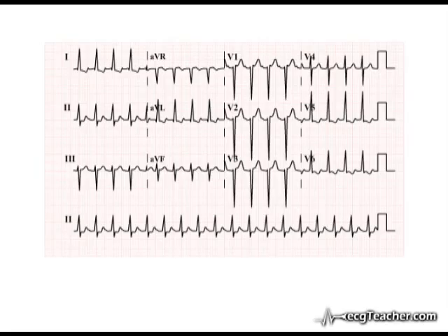We note that his heart is structurally abnormal, with clear evidence of left ventricular hypertrophy on the ECG. We are aware that hypoxia is a potent trigger of arrhythmias in the presence of heart disease. We also note that the tachycardia is monotonously regular, with a heart rate of 150 beats per minute.